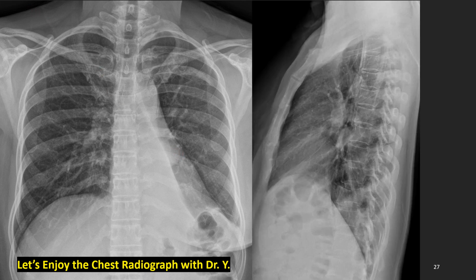This is the lateral film of left lower lobe collapse. What do we see? What don't we see? Only one hemidiaphragm. This is normal right side. Left side is obscured from here. And increased triangular opacity about here. Increased white density of left lobe collapse.